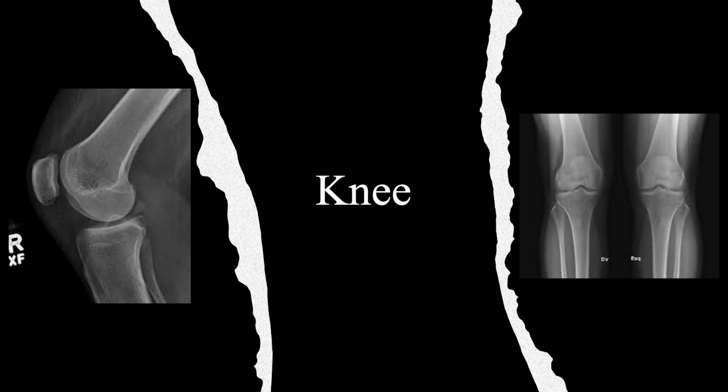Make sure that the patella is less than or equal to 1.2 times its width from the tibial tuberosity. So what that means is you want to do that more on a straight leg. However, the distance between the tibial tuberosity here, about here, and then here, and the patella. So the patella is less than or equal to 1.2 times its width from the tibial tuberosity. Again, kind of difficult to see, but you can see here, this is where the patella is supposed to be.